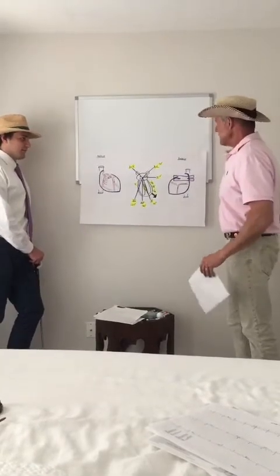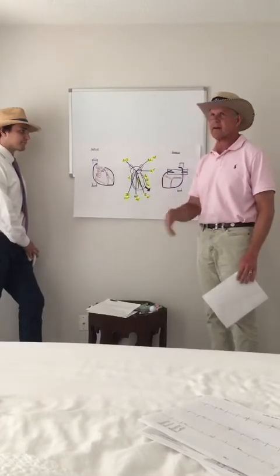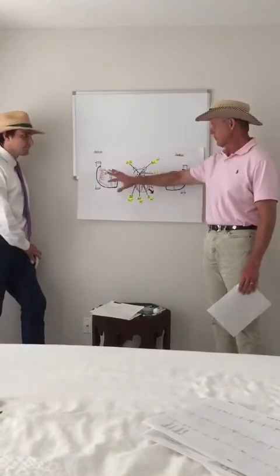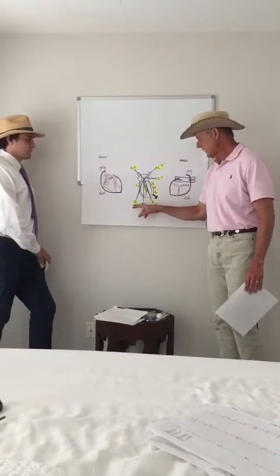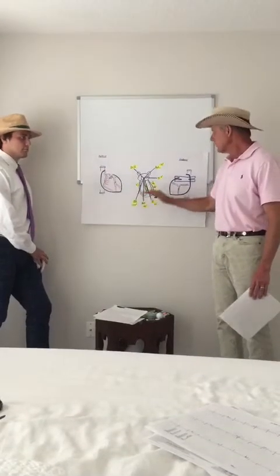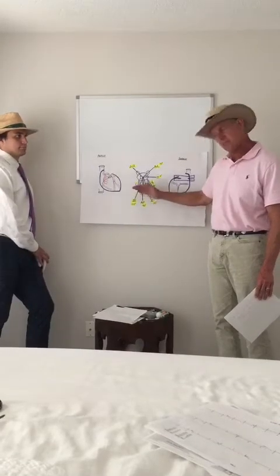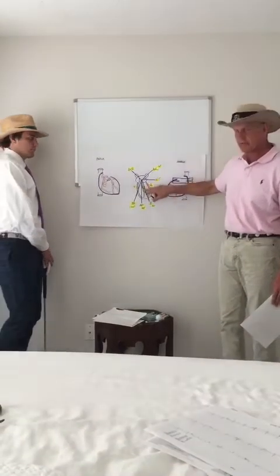As Will was saying, the utility of the RAT is that if you know that ST elevation is a sign in certain circumstances, particularly if it's convex, then it's an indication of an acute myocardial infarction, and Will was relating to arteries, and we'll go over that in more detail later. In the first EKG he showed you, he saw acute ST segment elevations in 2, 3, and AVF, so you know that that's an inferior infarct. If you look at the RAT, you can memorize 2, 3, and AVF, and that's indicative, or you could just be able to see it. In the RAT model, V2 and V3 look at the anteroseptal region, or the septum.